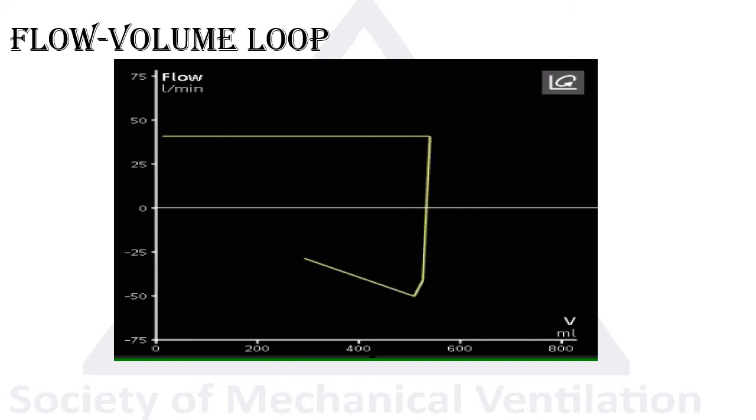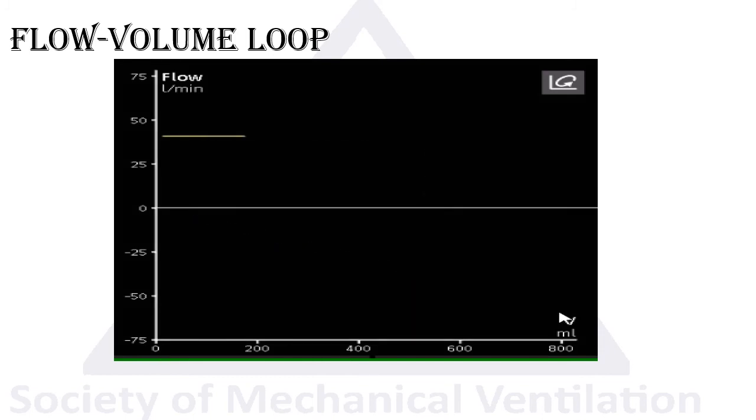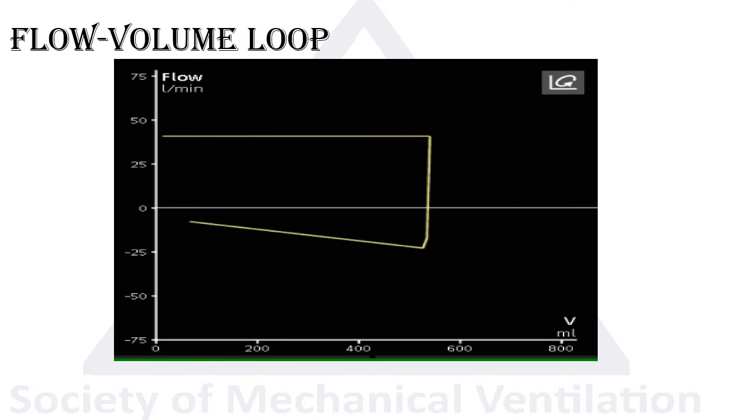Sorry, it will take a couple of seconds until it sets that, but again, keep noticing. So the expiratory flow starts to become short, and you can see the slope is going to start to be slow, and you might see the effect of auto-PEEP. Again, it's not totally set to the resistance that I set. I set high resistance at 30 and compliance of 100.